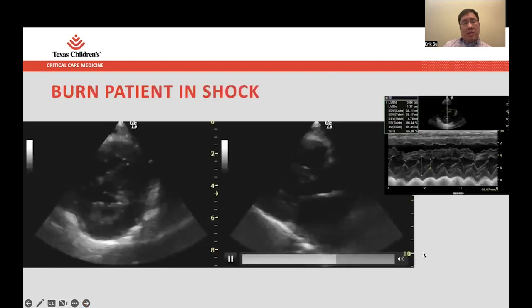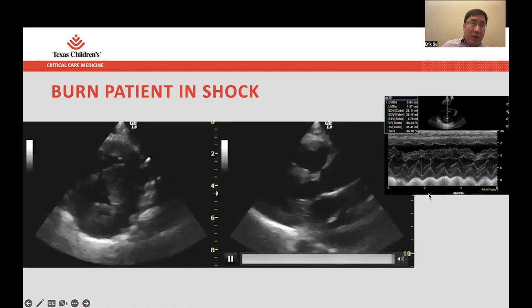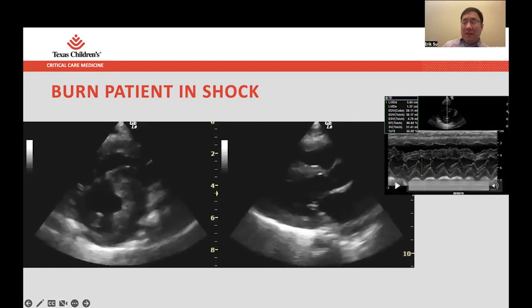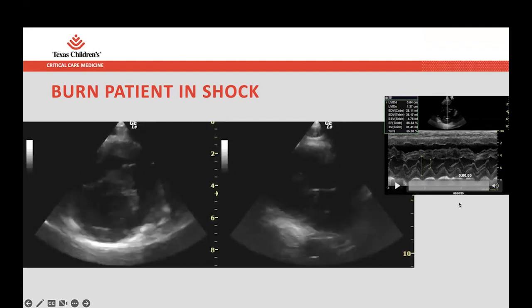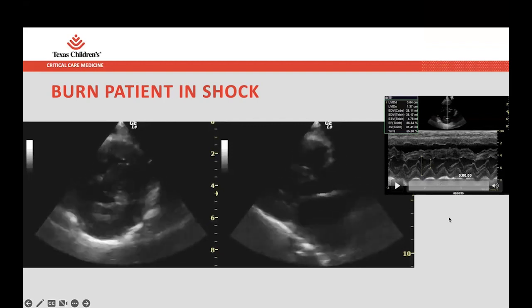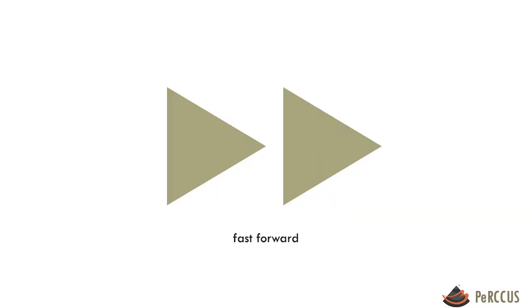I want to give everyone the chance to chime in here. Don't worry, we can mute out your responses so that you don't have to worry about this being on YouTube and everything. But I just want to give a chance for folks to look and see what they think, and I'll give you all a few seconds, and then we'll just keep going. But what do y'all see here in terms of these parasternal views? Parasternal short is on the left, parasternal long is on the right.